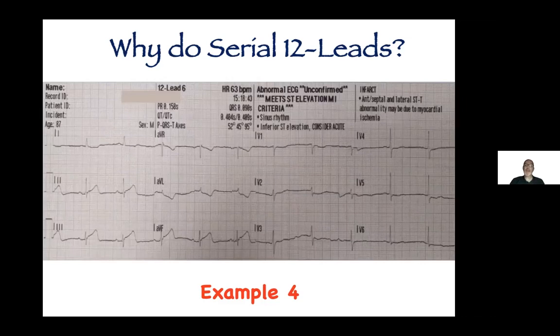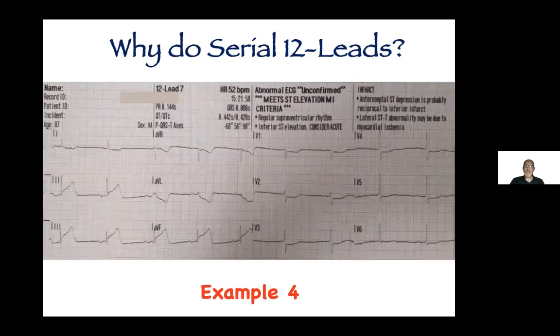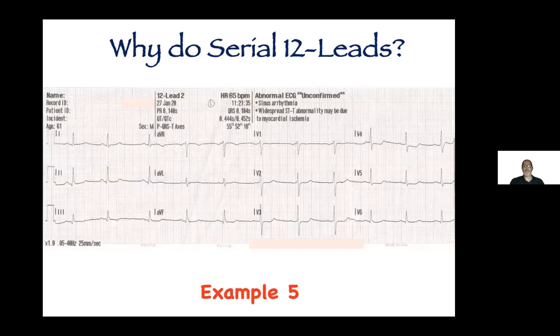Well, you should have figured that out from the second one when you noticed AVL's ST depression was continuing to get worse. Don't let it get to this point. So just do serial 12 leads, and it just continues to evolve and evolve and evolve, okay?